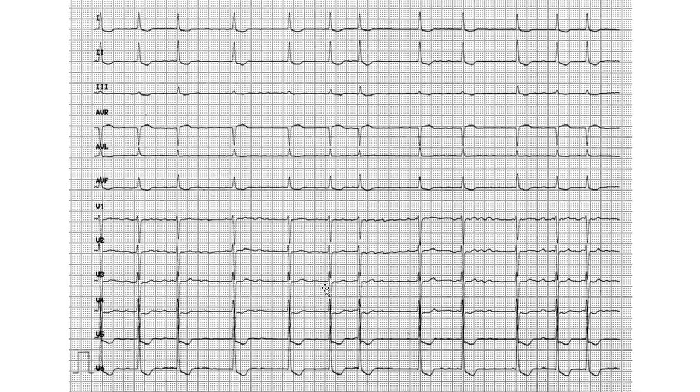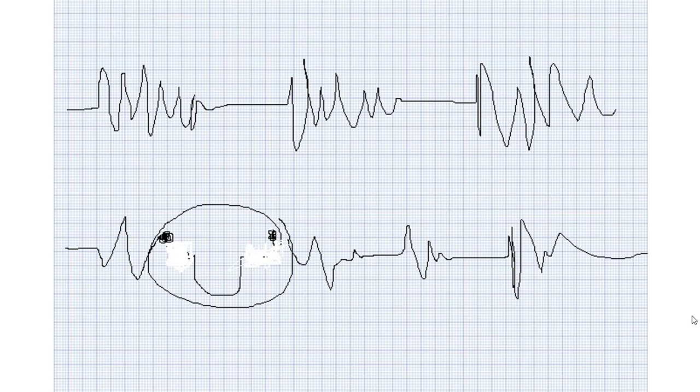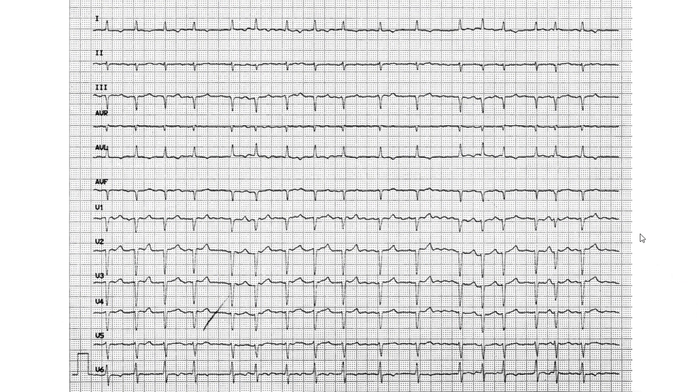So that's it for that example. For the most part, we're done. Then we don't calculate PQ, of course. Next example, this is a happy heart syndrome. Next question. So this is question 27. Okay, whenever you're ready, and then we can tackle it.